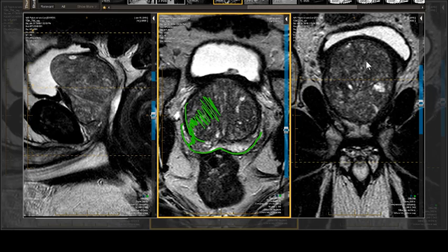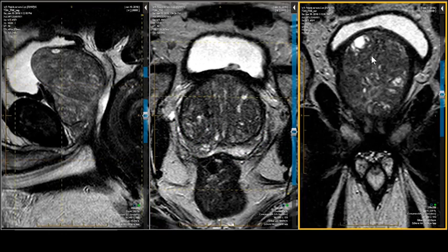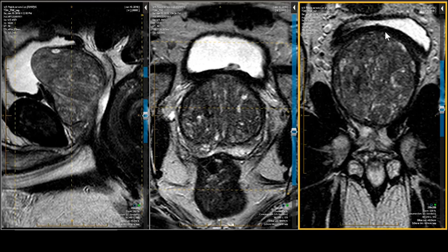So in the coronal projection, this type 2 BPH, because it's posterior-superior, really presses up on the bladder. And occasionally, it'll look a little bit like a piece of broccoli or cauliflower. It'll have segments that extend off that are a little bit pedunculated into the bladder. And when that happens, the necks of these pedunculated areas of BPH can get trapped within the bladder and cause problems of their own. So this is a patient that demonstrates really profound elevation of the bladder with marked trigonal thinning right here, which is part of this form of BPH.